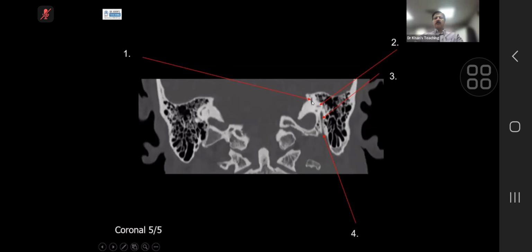Okay, last section, coronal. Number one, number two. These are harsh because you just see them partially, but you can imagine something going superiorly, you can imagine something going laterally. And then you can see that something is going inferiorly. And then this thing here, number four. Yeah, very good.